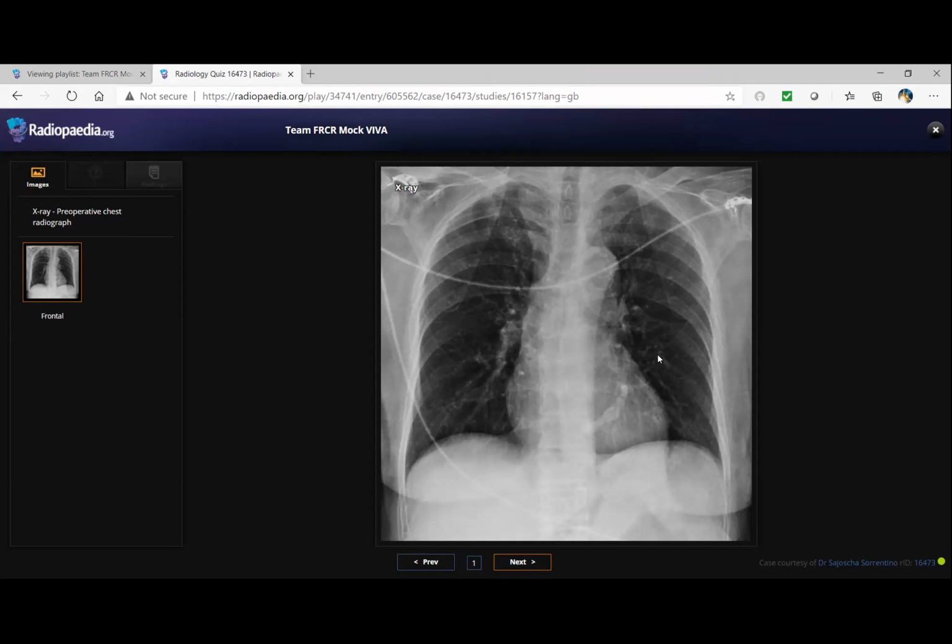So this patient is generally well. He's only going for preoperative screening, okay? But he's having some arrhythmia every now and then. So could this narrow your differentials? Yeah, it can be calcification of a valve as a differential.